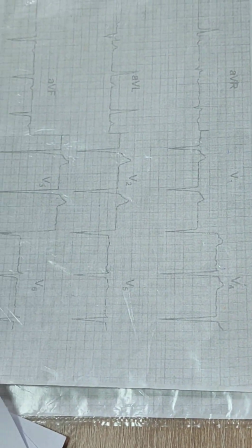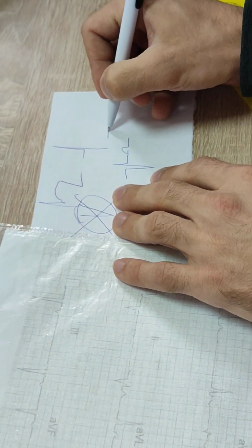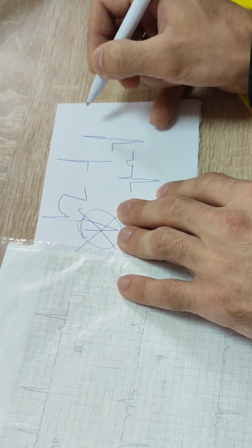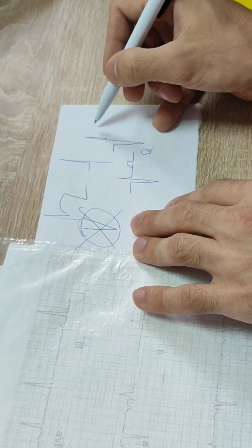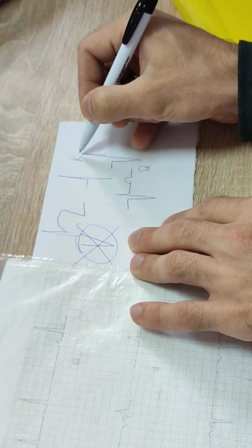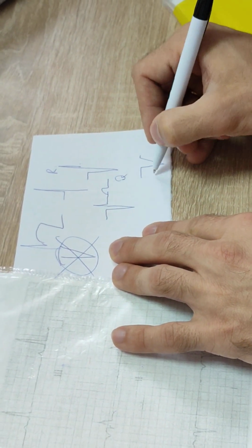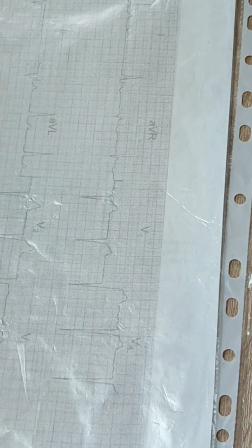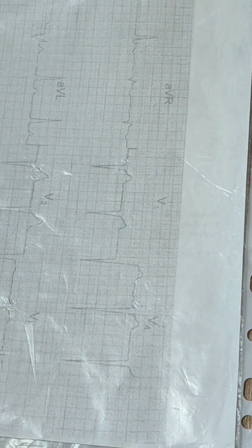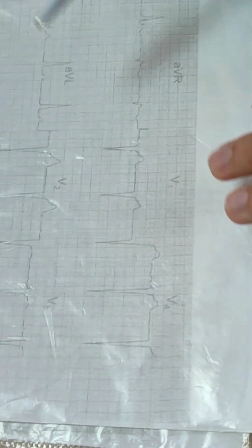Is it big focal or transmural? If there is Q, R, and ST, T, independent of other conditions, it is big focal. If there is QS and no R wave, it is transmural. So is this one an R wave or not? No R waves. That's why it is transmural.